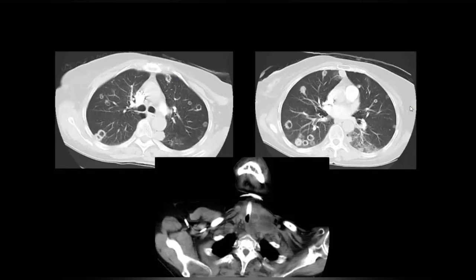Now, very few of the tumors can cavitate. Top of them will be the squamous cell tumors, as you mentioned, either from the lung or the head or neck, or from the uterine cervix. And uniquely, these nodules tend to cavitate even if they are small. So you see, the nodules are small, but they are cavitating. It's not an outgrowth of the blood flow; it's an innate thing within these nodules.